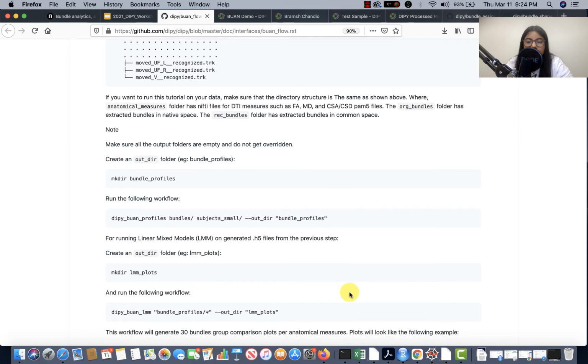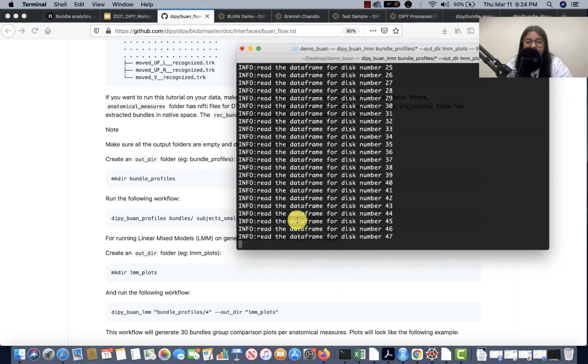let's go back to here. So we are at 48. I just want to mention the data we have here. We have a very rich representation of data. We have many points on streamlines, and we're using all the streamlines and all the points. That's why it may be taking a bit of time, but it's a lot of data to process.